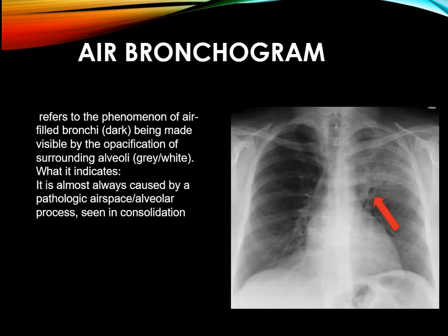The air bronchogram sign is another important radiological sign. It refers to the phenomenon of air-filled bronchi being made visible by opacification of the surrounding alveoli.